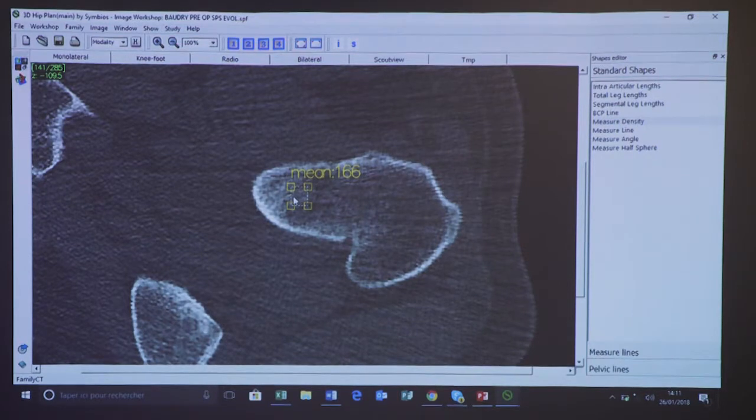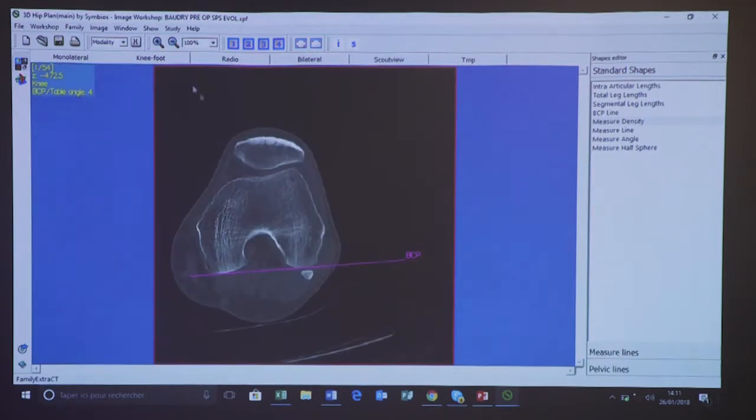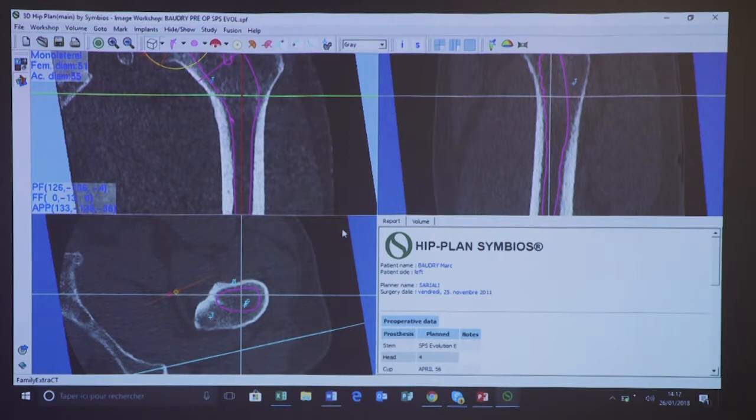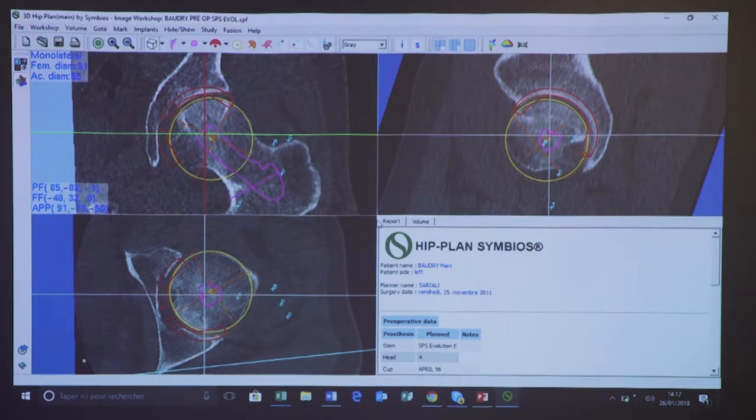And as our colleague told us just beforehand, I would use, like the trauma ones, the flexible reamers because it's much easier, and if needed, we can use a flexible guide in order to find the femoral axis. So afterwards, here we analyze the knee also to get the referential for the femoral offset and the femoral anteversion. Okay. Afterwards, first step is to analyze the acetabulum.